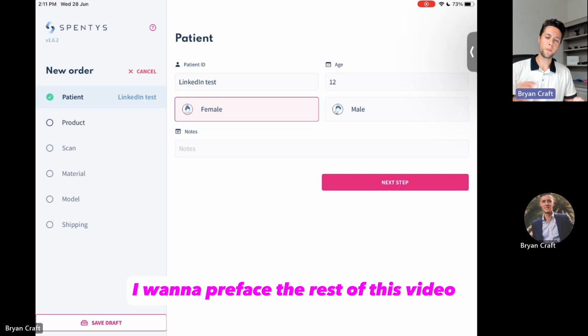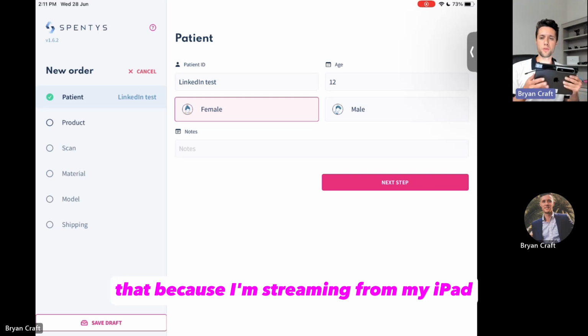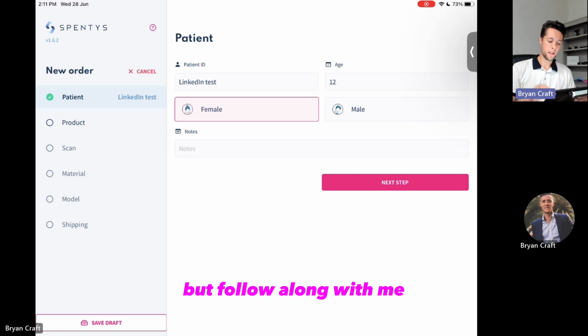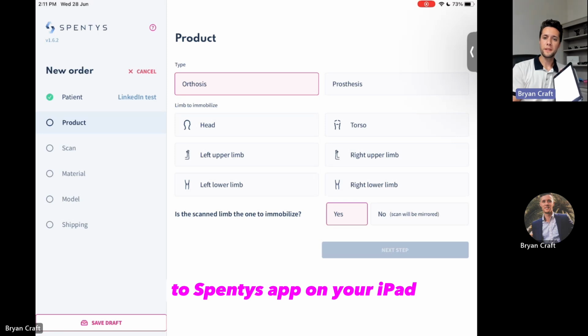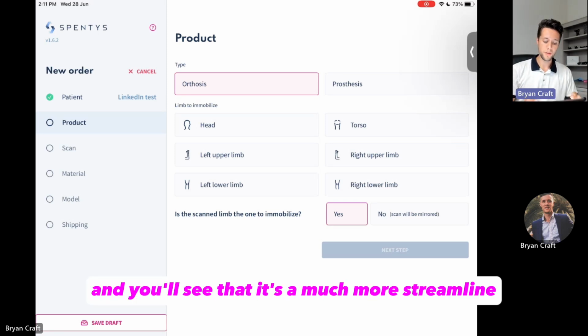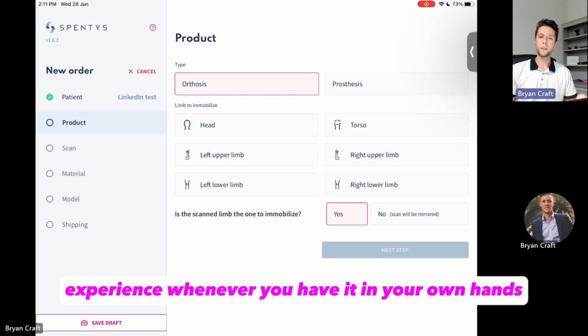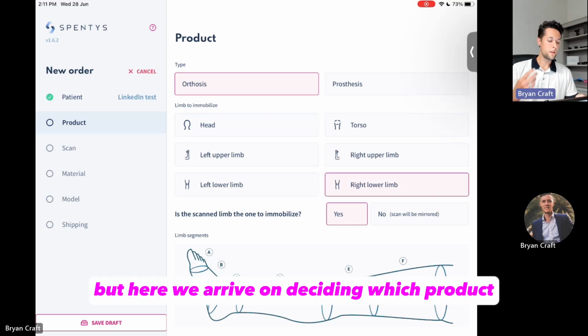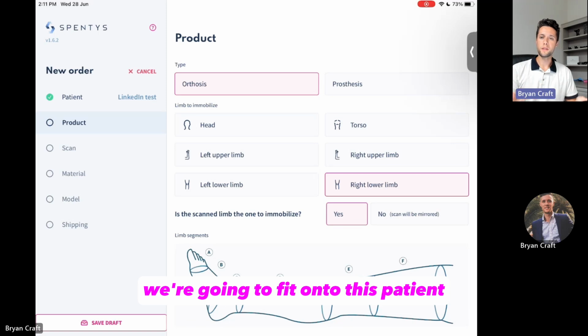Now, I want to preface the rest of this video that because I'm streaming from my iPad to my computer, it may be a bit laggy, but follow along with me. Know that you could download the Spentys app on your iPad and try it at your own pace, and you'll see that it's a much more streamlined experience whenever you have it in your own hands. But here we arrive on deciding which product we're going to fit onto this patient.